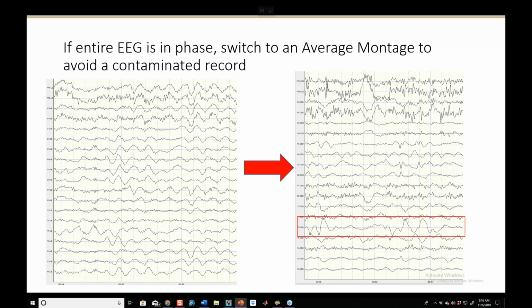I'm taking the ears out of the equation. So there's no more contaminated earlobe. The neutral spot that was not truly neutral has been removed. And what it's revealing to us at T5 here is that it was T5, that left posterior temporal lobe, that was trumpeting that slow wave out throughout the entire record and effectively confusing us.